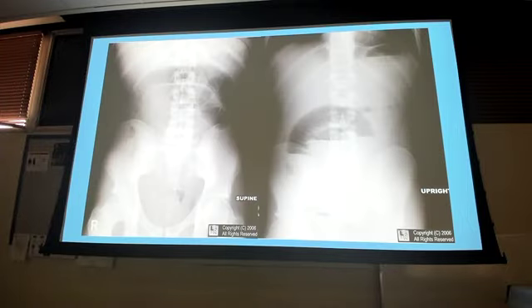All right, just a couple more review slides and we'll get you on a break. Okay. So the difference between this here, not really different, this is showing you supine and upright of a small bowel obstruction with dilation. Okay? There is no way you can tell me based off these pictures if this is an obstruction or an ileus. You need the patient presentation and the physical exam findings because they look exactly the same on x-ray, right?